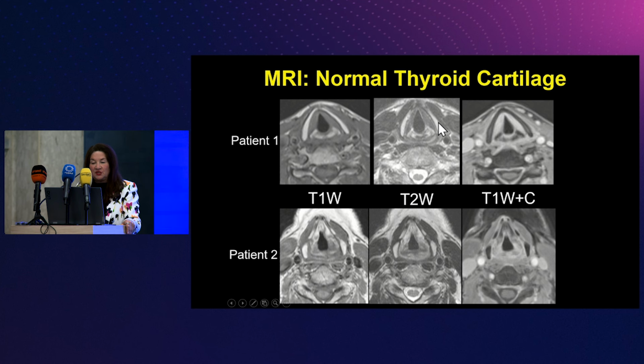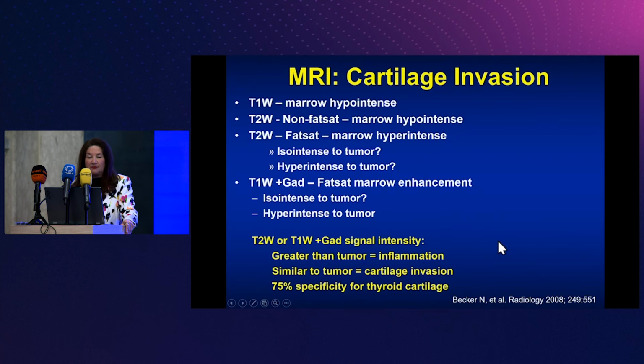On MRI, you want to see on T1 weighted imaging, hyperintense fat, look at the symmetry. On T2 weighted imaging, high signal intensity, similar to fat. And on fat suppressed enhanced imaging, nice suppressed marrow. That's what normal looks like. Here's a different patient, different pattern of mineralization, but look at the marked symmetry here and nice post-contrast images showing the suppressed fat in the marrow.